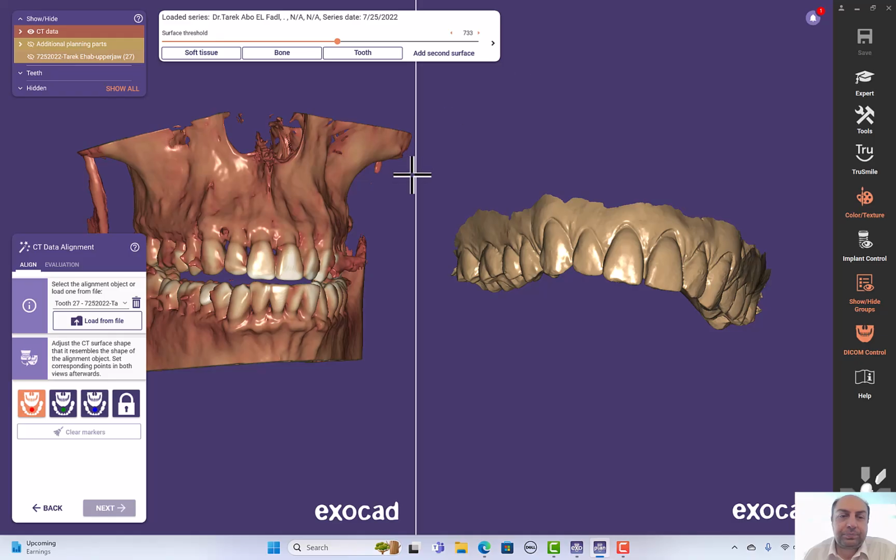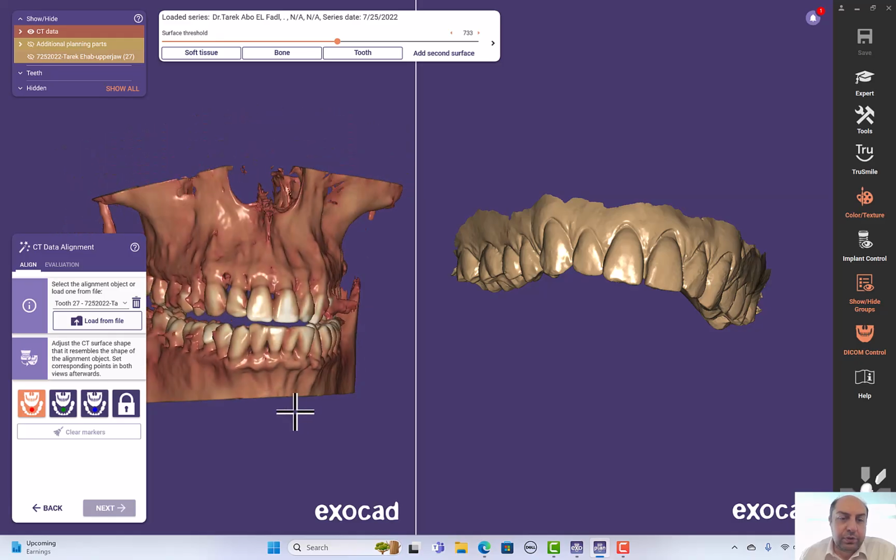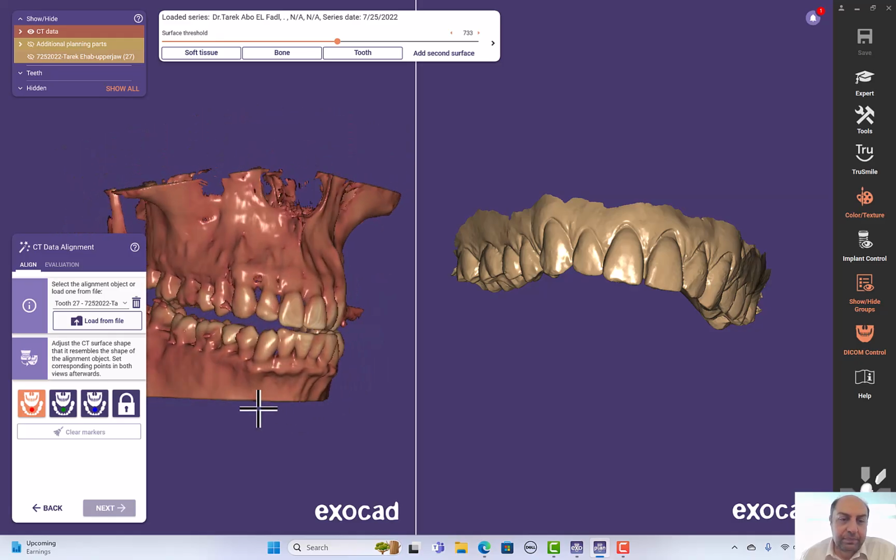A final trick, always ask your lab or radiology center, or if you have a cone beam CT, for implant cases, try to separate the teeth from each other. This way, you will guarantee that you will be able to get the most of your CBCT regarding points for registration, cusp tips, and so on. If you have the patient in occlusion, you can't see the cusp tips anymore, and this makes your job more difficult. To see the cusp tips, I have a nice trick.